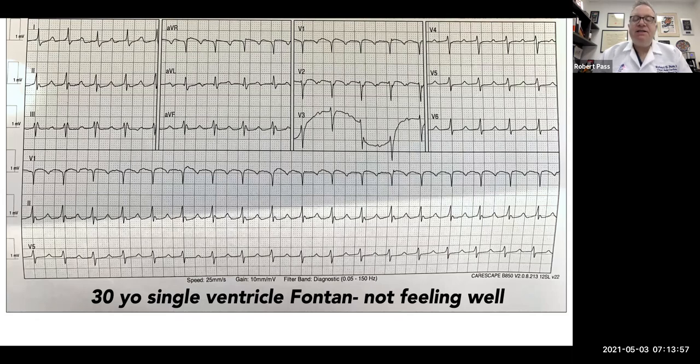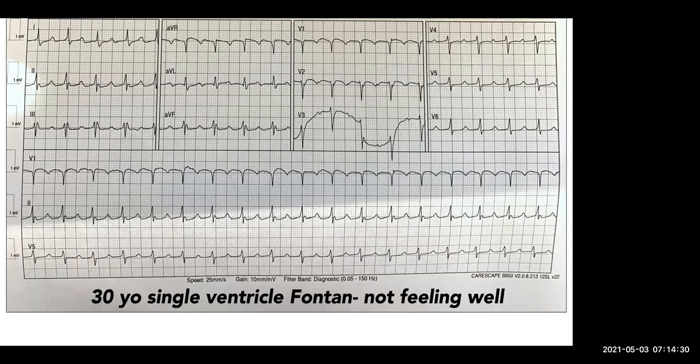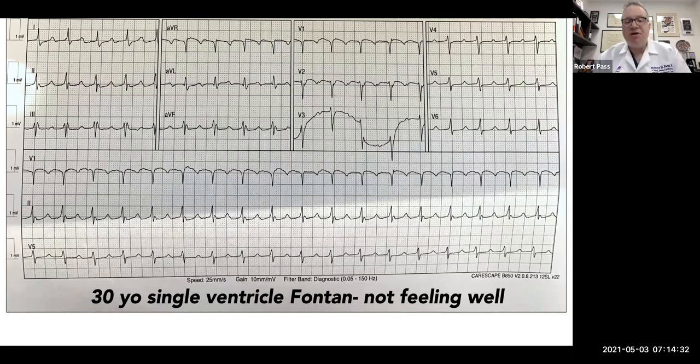Okay. And in actuality, if you look here in V2, this little blip, which you can see evidence for some kind of a secondary hump on the T waves in a number of different leads, which absolutely you could have read out as just being the T wave, and you would not have been wrong. But in fact, there is a little P wave here. So this is actually one-to-one IART, and this patient ended up getting cardioverted, I believe, and got an ablation.